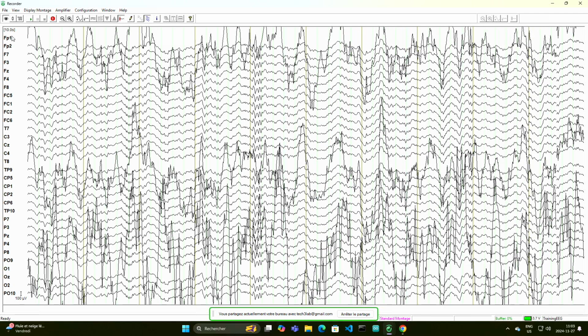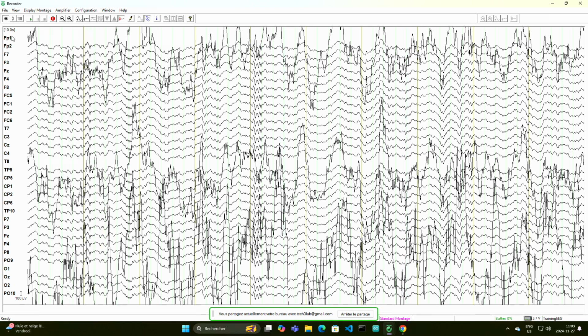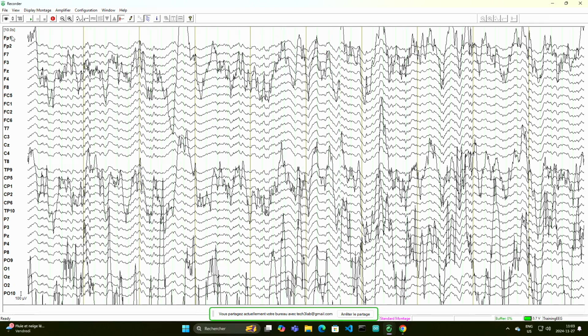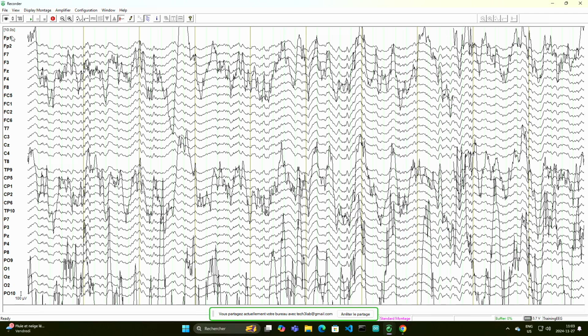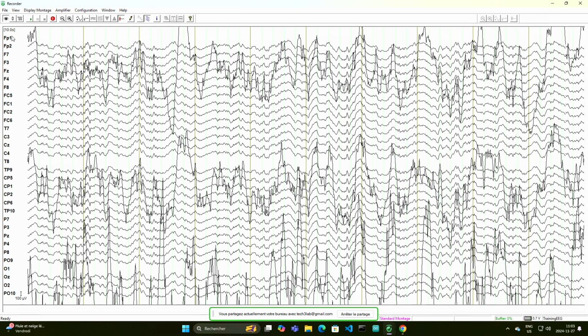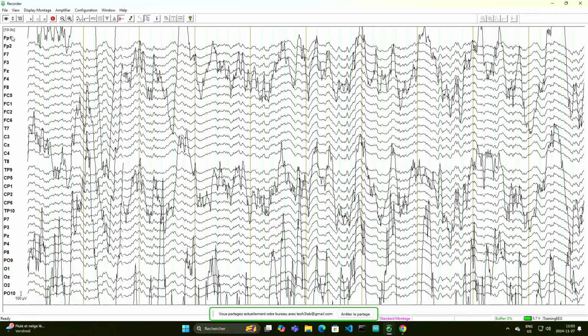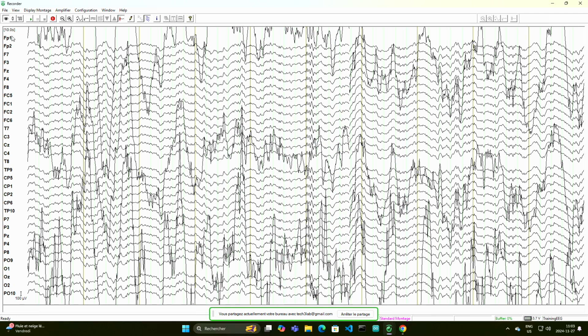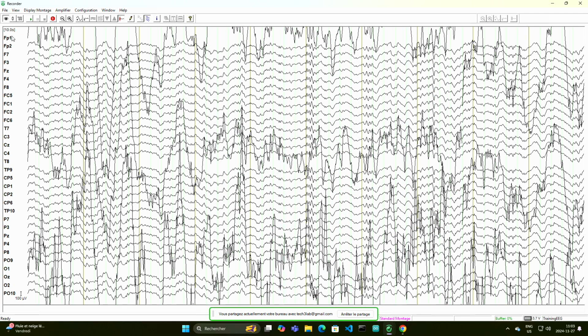And you can see that there are some very high amplitude squiggly marks on here. That's normal. We don't have any conductive gel applied yet. However, for dead channels, what we're looking for is a completely flat channel. And we don't see any of those. So that's good news for us.